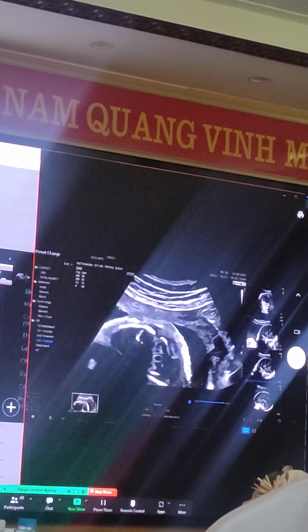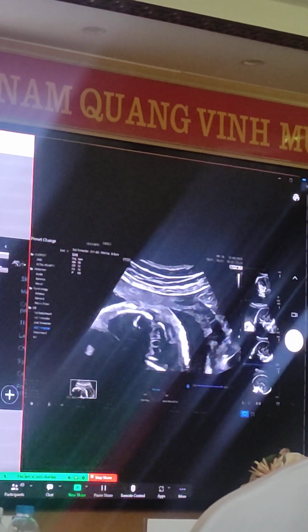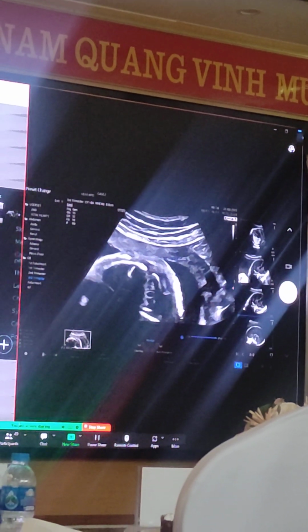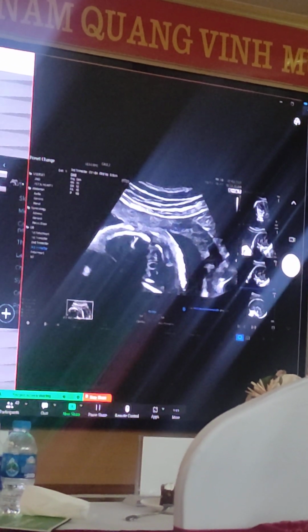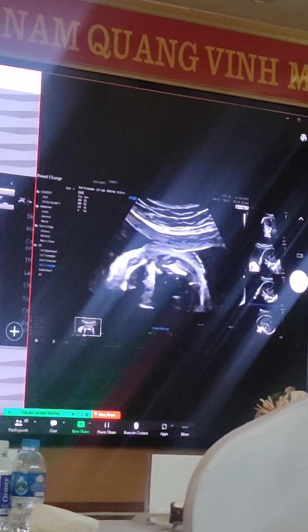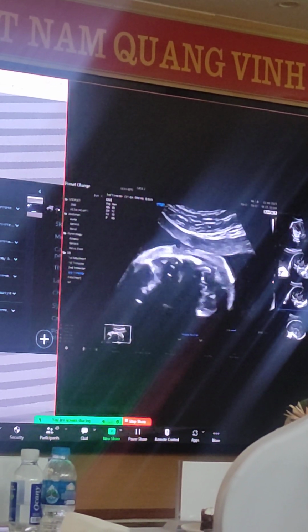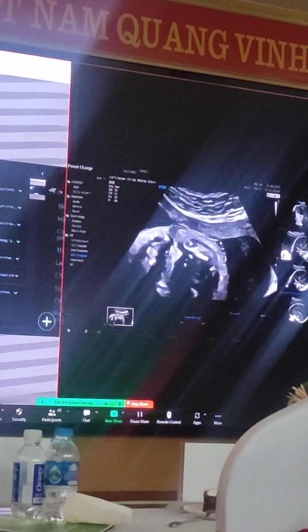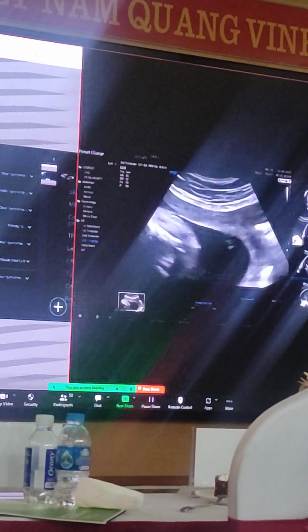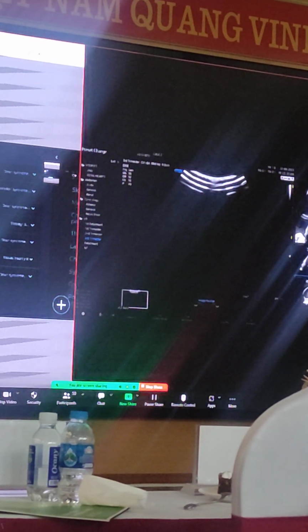Also, if you still think about CHARGE, you've seen the external ears, they are symmetrical and normal. You can look at the internal ears, and you look at the semicircular canals here. So you see at least one, and that's probably enough. If you want to see more about the canals, you would ask for an MRI. But here you can see at least the upper part of the semicircular canals, because there's an upper one and a lower one. Then you move to the face.